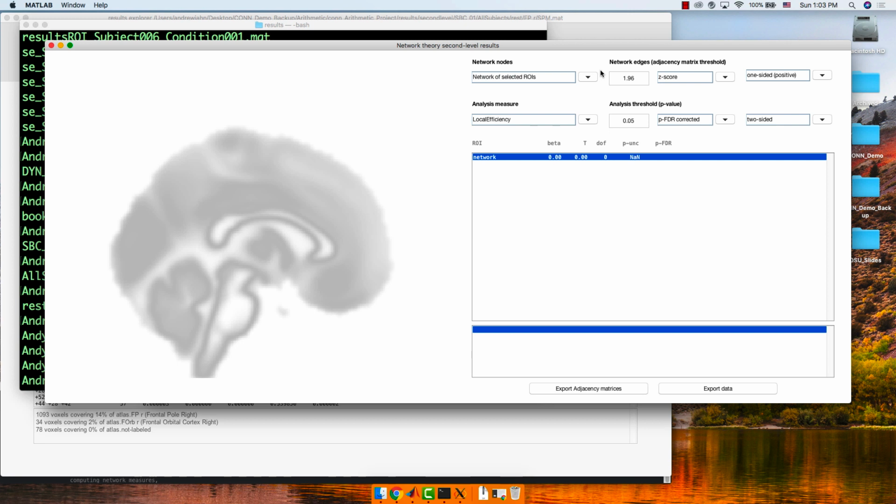Okay? Yeah, Mike. Sorry, can you import your own analysis? Does it have to be set up so that it'll play nicely with this, or how? Yeah. Well, as I'll show you, if you have your own custom atlases, you really just need to define in MNI space, I should emphasize that, in a template space, which voxels contain what index. So if these voxels over here are 1, these over here are 2, and I also assign them a label, then CONN will read them with no problem.